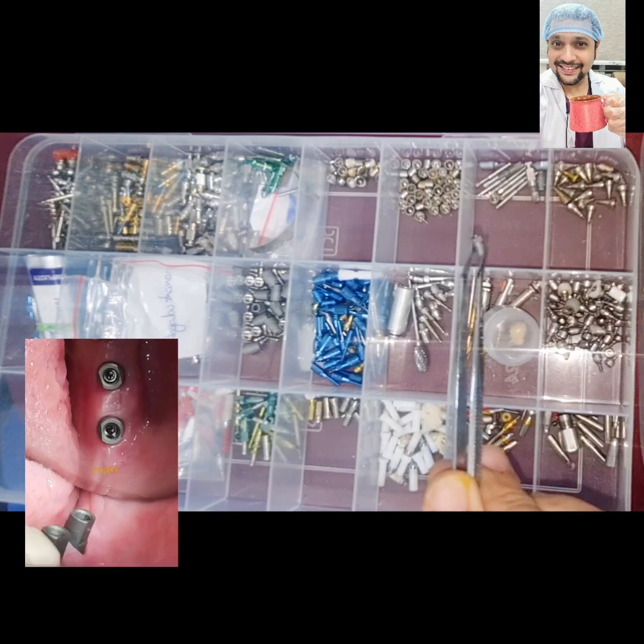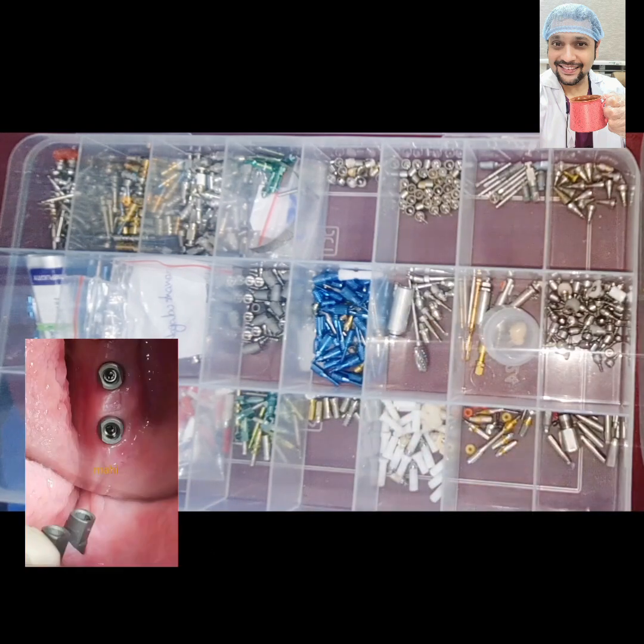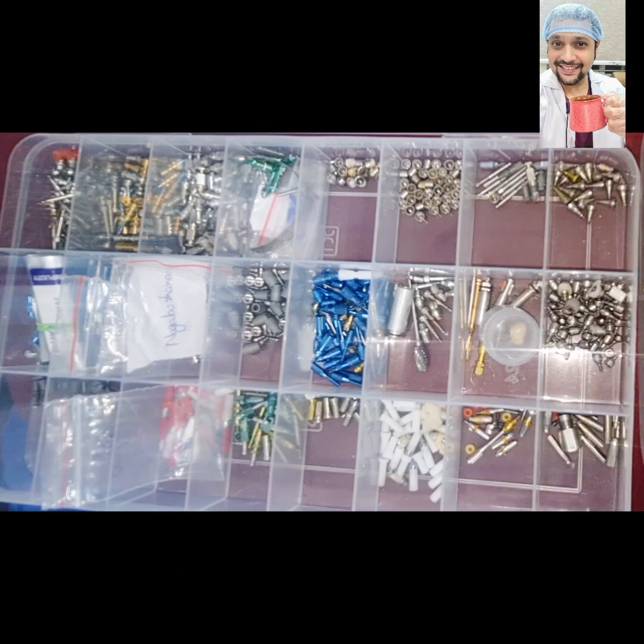The flat surface can be oriented towards buccal or lingual, so that when the scan is done, the lab technician can visualize this in exocad, catch it up well, and then he can design the prosthesis accordingly. There are schools of thought where they say that it is okay to use these flat surfaces proximal also when we fix it into the implants, but for an easier reproduction of the details, you can always use this flat surface, either buccal or lingual.